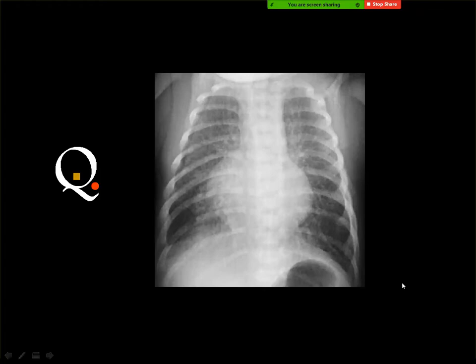Interstitial lung emphysema? No. Respiratory distress syndrome? If it is premature, it is hyaline membrane disease. No. The lungs are aerated, and you can see the vessels. Hyperinflated.